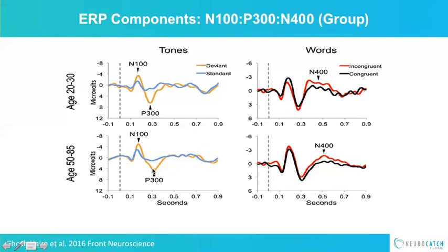This is that peak that is that unexpected, right? This deviant tone. It was like a stick snapping in the woods. Your basic attention to the difference, and you're processing now. You're processing at a sensory level. This is you processing attention going, hang on, that wasn't right. That didn't fit. That was a rare, louder tone. And then you can see they return back. And this all happens in the space of seconds, right?